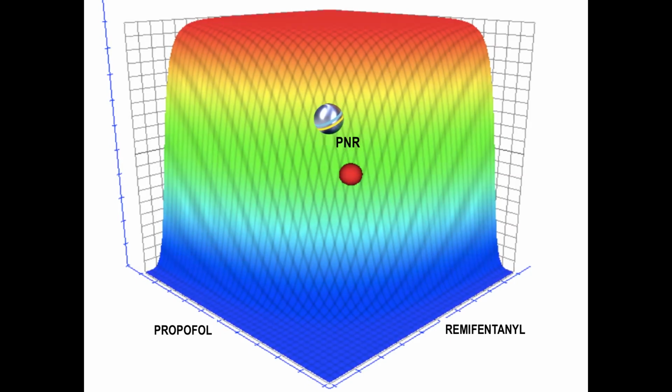To navigate in TACAN 3D, it is highly recommended to use the monitoring of the depth of hypnosis and, as much as possible, the monitoring of nociception.